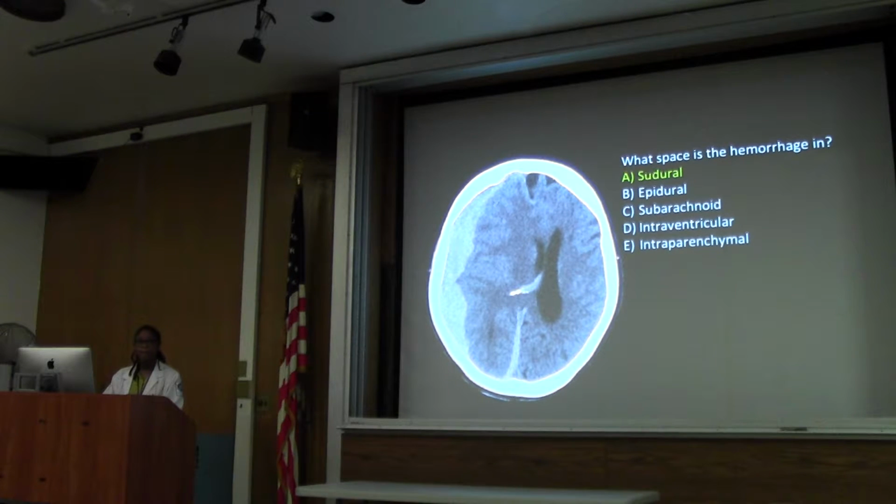What's going on in the middle? This thing here? Yeah. It could be some blood, or it could be the choroid plexus that's being smushed over. It's hard to see based on this image, and this is not my case, so I didn't see the original image to know what it is. But this is subdural blood here, extending from the convexity and into the interhemispheric fissure.